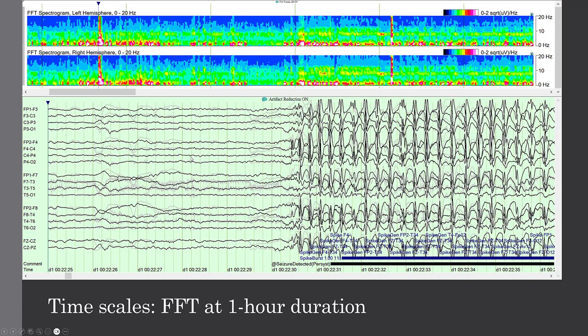Now here's another look at an axis. We've looked at scaling the microvolts per hertz. Let's look at change in the time axis here. Now this is set to 1 hour. And this is a recording with 3 hertz spike and wave seizures, and they're about 14 seconds long. Now, FFT spectrograms show all the amplitudes, not just the rhythmic components. We'll look at rhythmicity spectrograms in the next section. So the seizure patterns are visible, but not as distinguishable from other non-rhythmic activity. So we don't get that distinction.